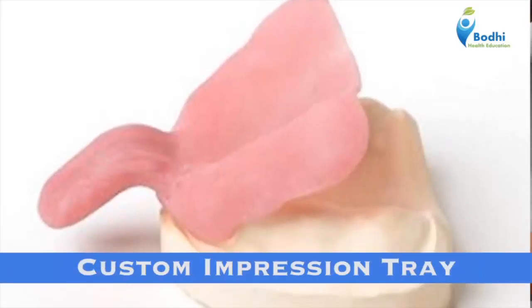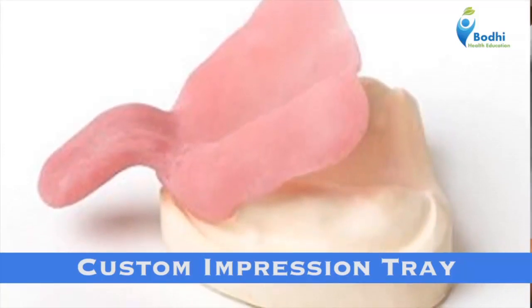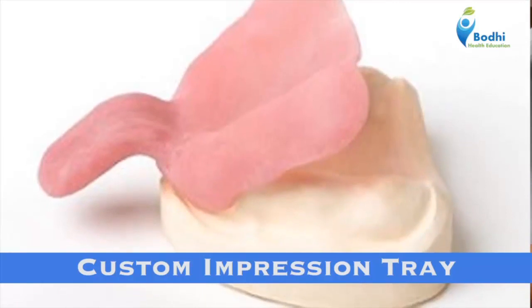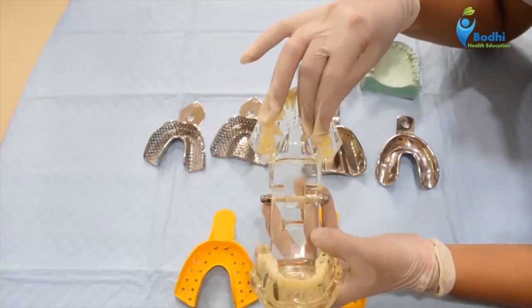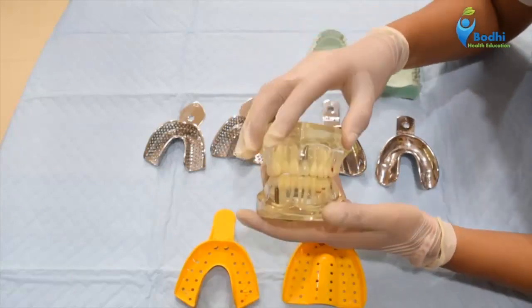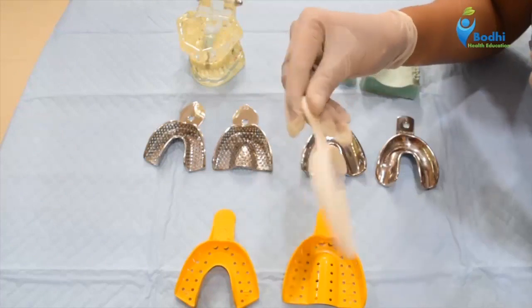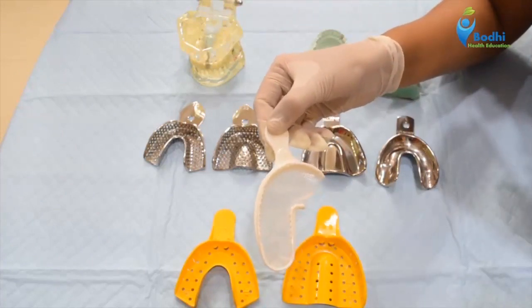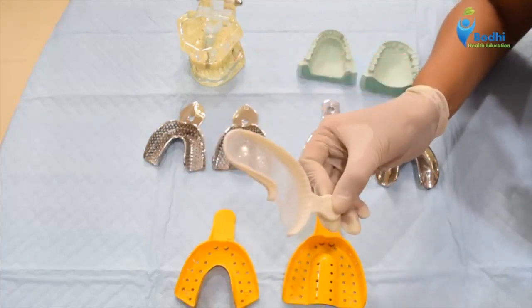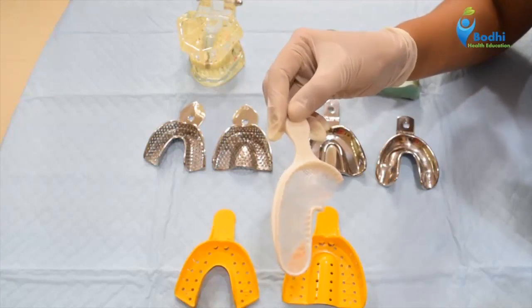There are custom made or special impression trays also, which we can fabricate in the clinic depending upon the size of the patient's jaw. They would be snugly fitting according to the patient's jaw size. These are disposable impression trays. That means once used, they cannot be reused. They can be only used once in a patient. They are used for the recording of the bite. These are partial impression trays.